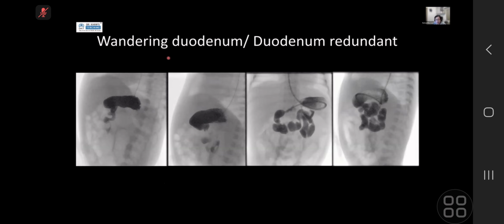And this is also called a wandering duodenum. It was described by Feldman in 1934. If anyone's interested, there's a radiographics article. Essentially, you have what we call elongation of the superior portion of your duodenum. You can see that this bit, usually the first part of your duodenum, first to second, is very redundant. You just wait a while and wonder where does it go? And then finally it does a little loop before it goes up to your normal position.